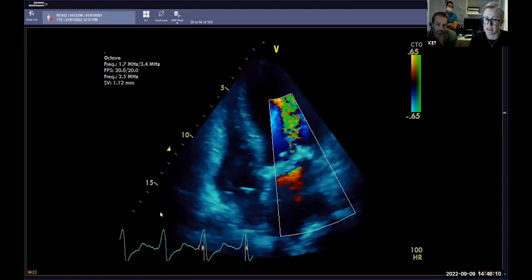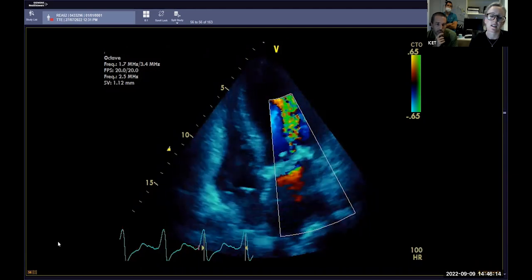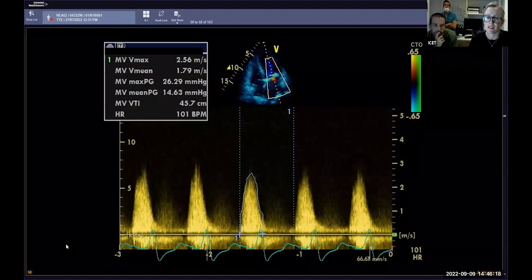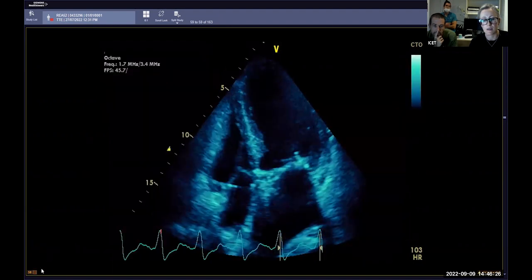But I'd be looking for reasons to make it worse, because I think it is worse than what I can see. So, I think I went with at least moderate on that. There were a few other images to look at. But yeah, they're all going to affect your gradient. So what else maybe can we look at as well as gradient?